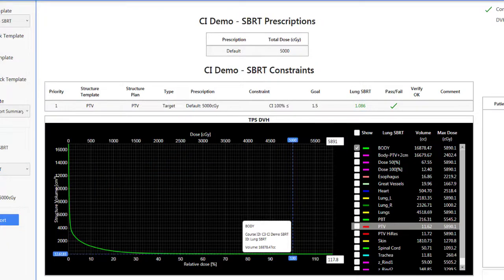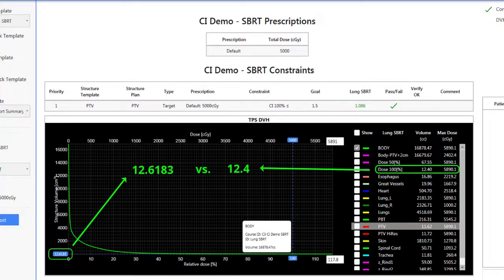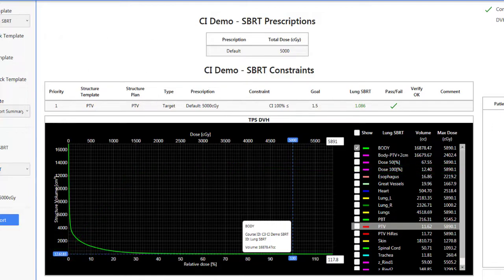This is also why users may see differences in manually calculated conformity index values when using isodose volumes generated from contours. Using the volume from a structure created from an isodose line will result in discrepancies.